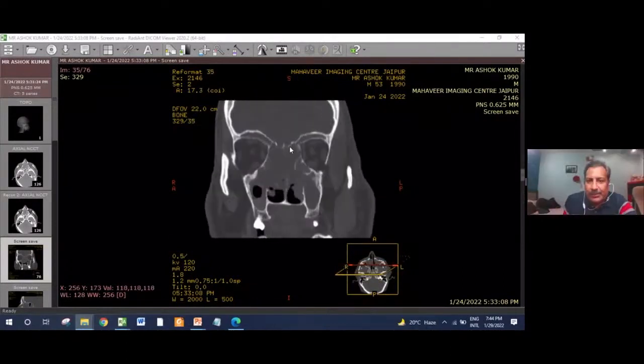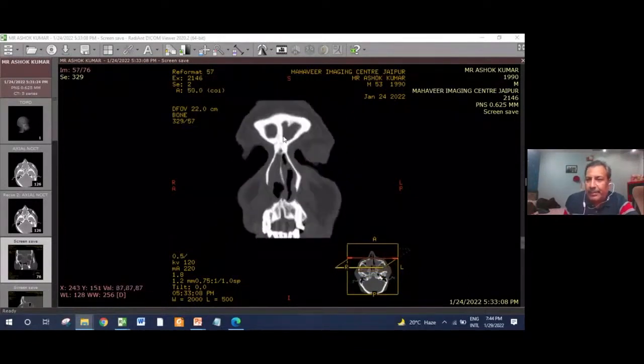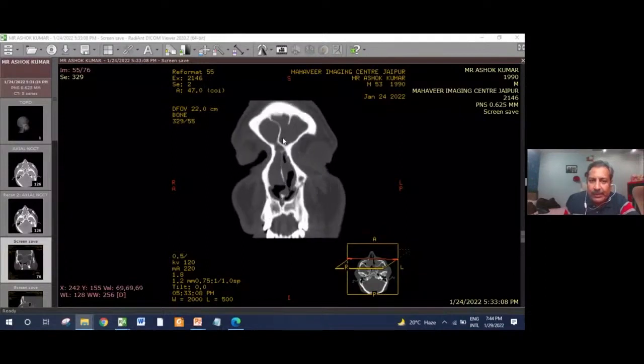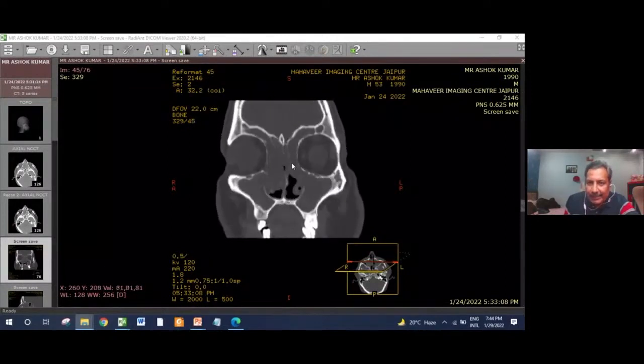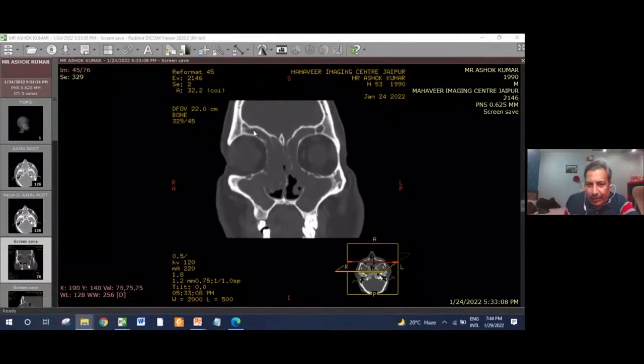Now see this particular patient. This is an amazing example of the supraorbital cell. See the frontal sinus in this particular patient. Look at the frontal sinuses. Now the frontal sinuses have gone. See the frontal recess. And see, I am going far behind. There is the cribriform plate. And see our supraorbital cellularity far, far behind and beyond. Can you see very clearly?